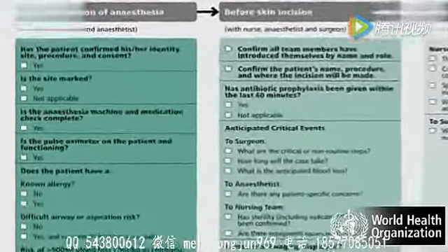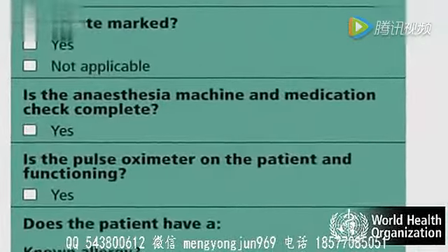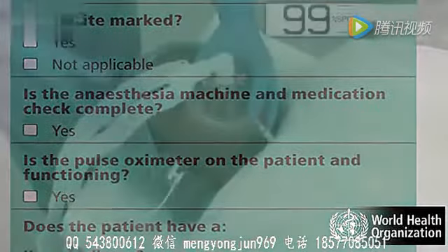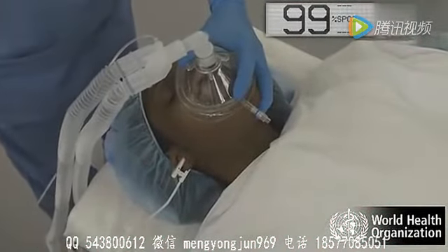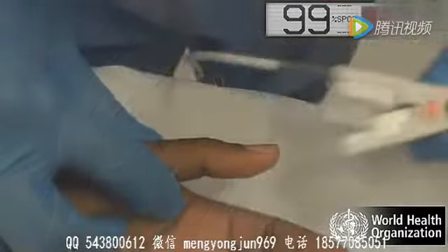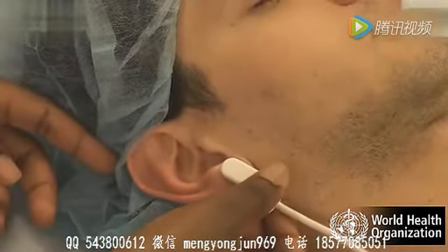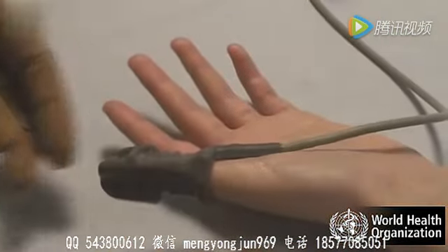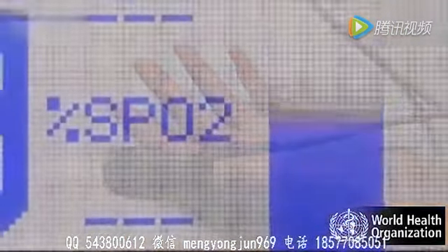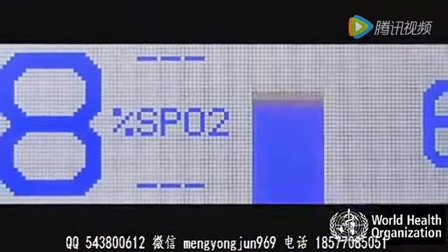Measures to improve anesthesia safety are integral to the program. In many countries, pulse oximetry is mandatory for monitoring patients during anesthesia. Although pulse oximetry is a simple and reliable technology that can detect low levels of oxygen in the blood, it is only effective if the anesthesia provider understands how an oximeter works and what to do when low levels of oxygen are detected. This video explains how pulse oximeters work and how to use them properly.